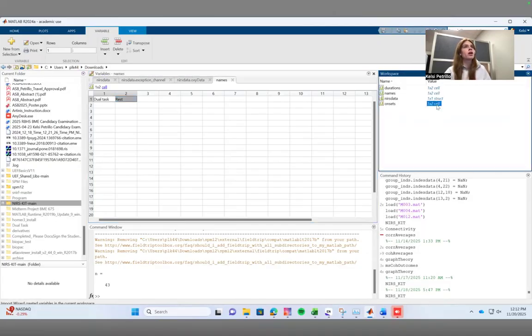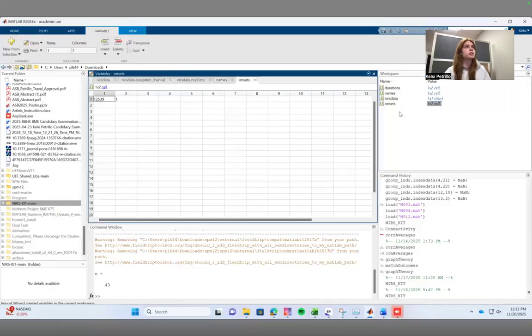And then we have this onsets field, and that's going to tell us which index those events start at. For this specific person, rest is their first task. It starts right away. And then around the 12,000th sample, there's a new event starting, the dual task. So we can use these two indices to also take into consideration in whatever we're doing with our data.